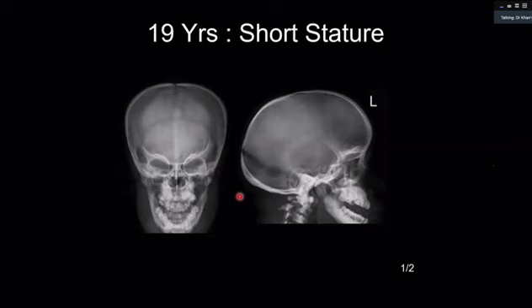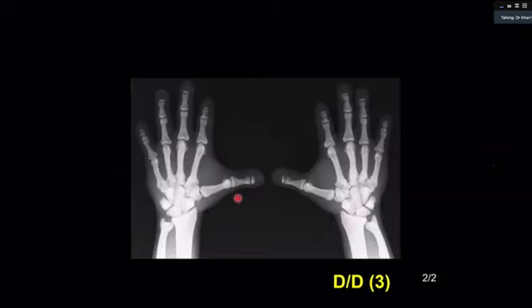So if you say that there is increased bone density and they tell you don't worry, then fine. Otherwise, they might help you. So the key thing here is that there is increased bone density. And otherwise, quite a few common things happen in pycnodysostosis, and that's why you can confuse it with cleidocranial dysplasia.